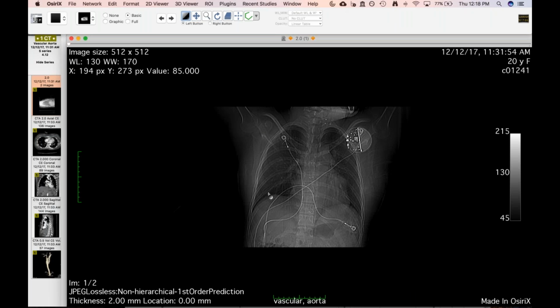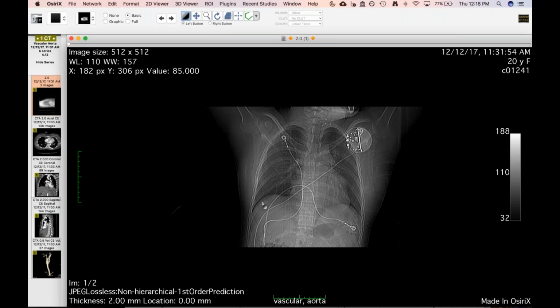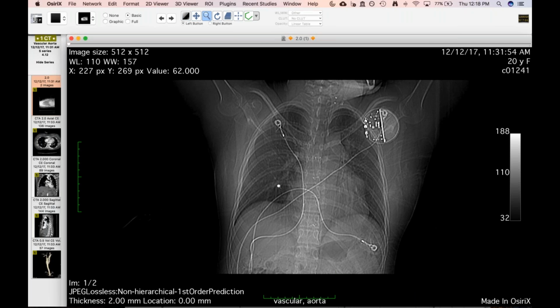All right, you see a scout from a CT. Yes. This just came into our pediatric congenital conference this week. This was done outside. She's 20 years old. She has a vagal nerve stimulator for refractory seizures and other neurologic issues related to her underlying syndrome. And David, this is nearly identical, but probably not as good as the case of this abnormality you showed. And unfortunately, I don't have a radiograph.